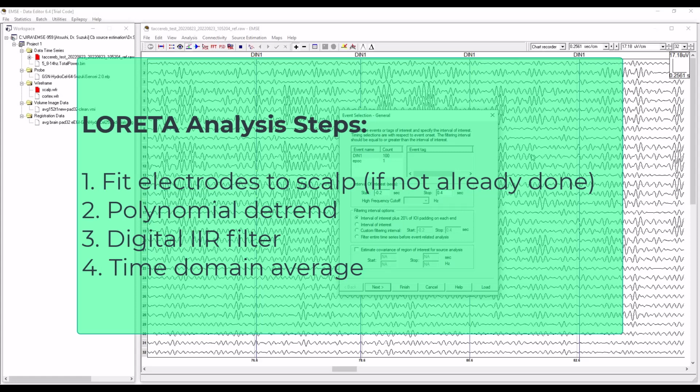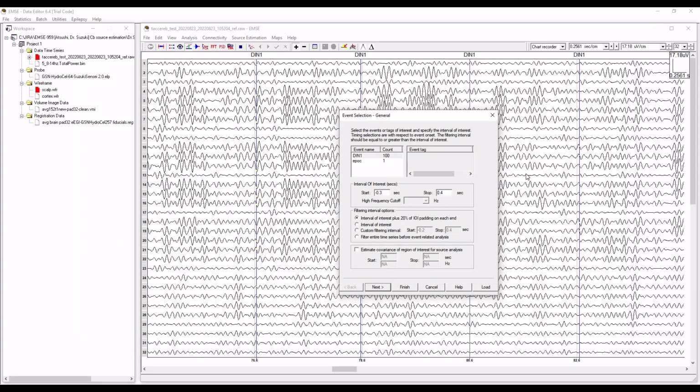I'm going to suggest that we try negative 0.3 to positive 0.3. The reason being that these are motor movements, I gather, and therefore the brain activity preceding the movement is significant. We can't really consider it to be baseline like we could with the stimulus. And we might expect the pre-motor activity to be at least as interesting as the post-motor activity, if not more.